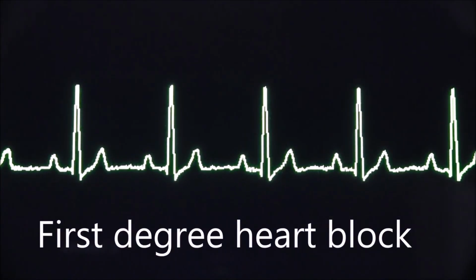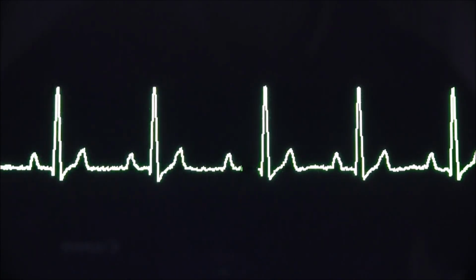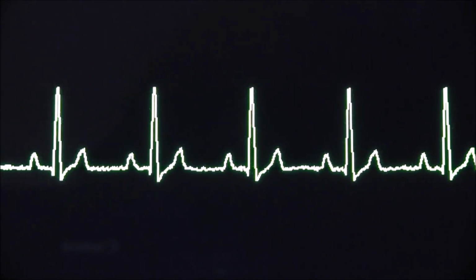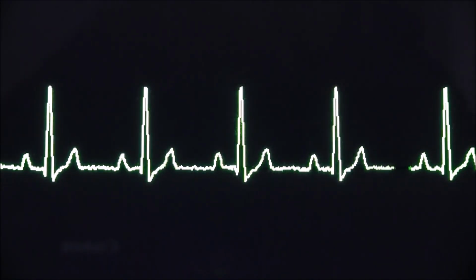Now at first glance this rhythm may appear normal as a P-QRST in the right order, but can you see the gap between the P and the QRS is prolonged? And if that gap is more than 5 small squares, which is 0.2 seconds, we would call that a first degree heart block. So this patient's in a first degree heart block.